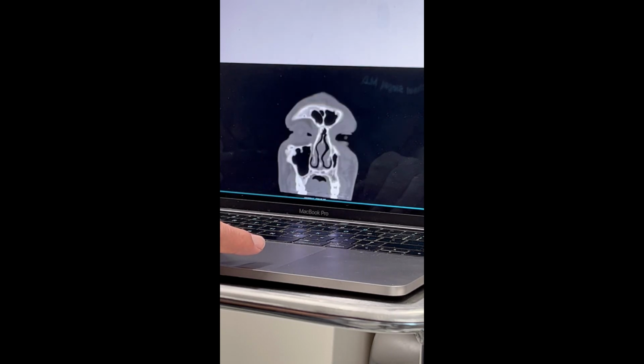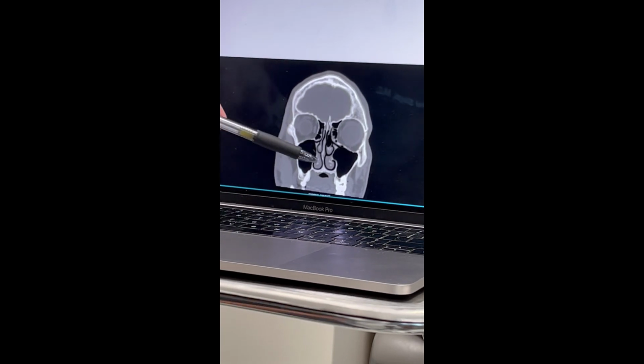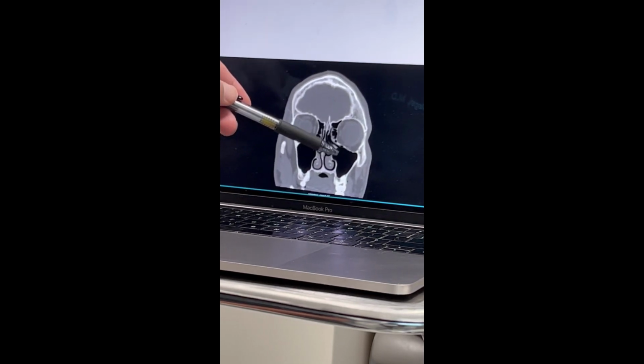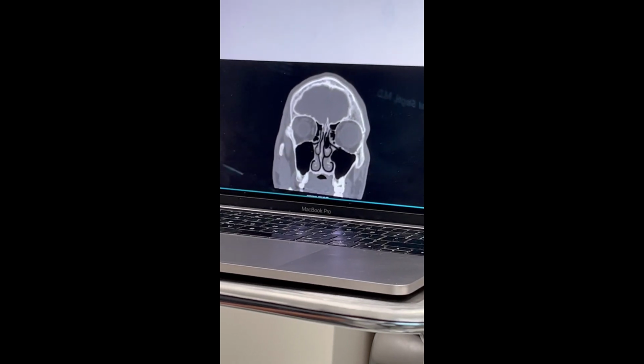Okay, so when we look at the turbinates, we're looking at two things. We're looking at the size of the turbinate, but also you can see in this wall here, the sinus here is large, and the turbinate takeoff is pushed towards the middle of the nose. So that gives us two ways of making the airway open. One is by shrinking down the soft tissue of the turbinate, but also by pushing the turbinate out, called an out fracture. We're actually giving ourselves a lot more room. And in this patient, the bulk of the room came from out fracturing the turbinate.